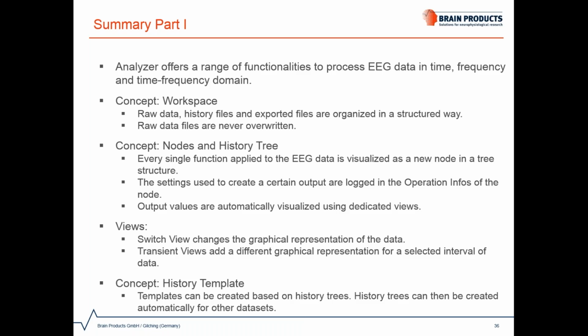To efficiently process a number of data sets, history templates can be created based on history trees. Simply create a history tree for an example dataset, save it as a history template, and apply it to all other datasets automatically. Of course, history trees are usually more complex than the one I've showed you in this example.